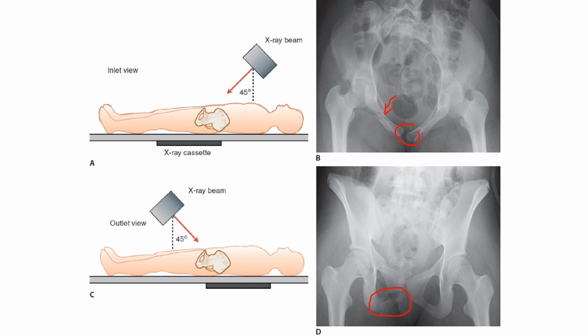Perhaps you will encounter this later in your advanced clinical studies, probably in third year in surgery. So for now, it's good to know that you have these particular views that may help you diagnose fractures of the pelvis.